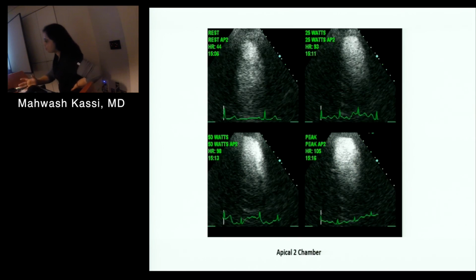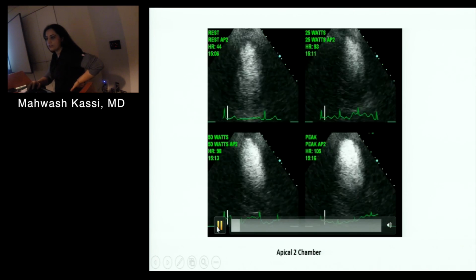This patient had an angiogram, but this is a multi-modality imaging conference. So he also underwent a CT scan. Oh, you've got to show them the two-chamber. Yeah, sorry. Okay, let me just show.